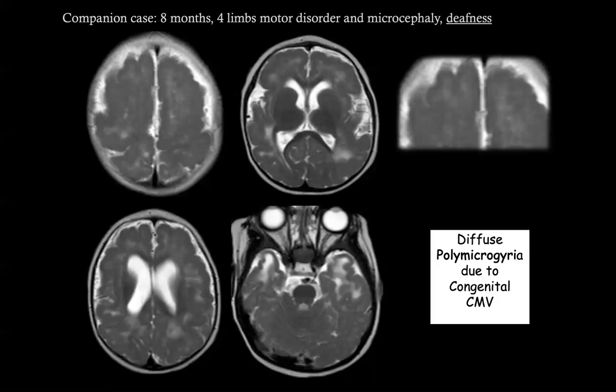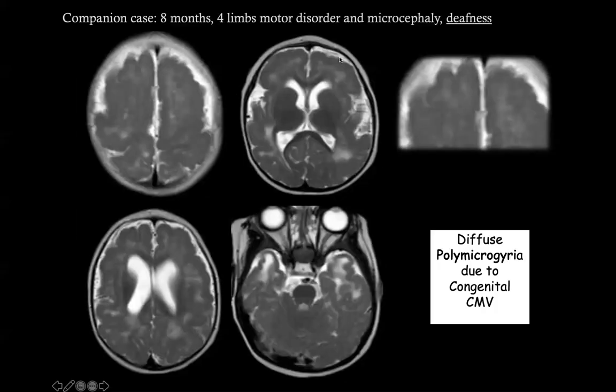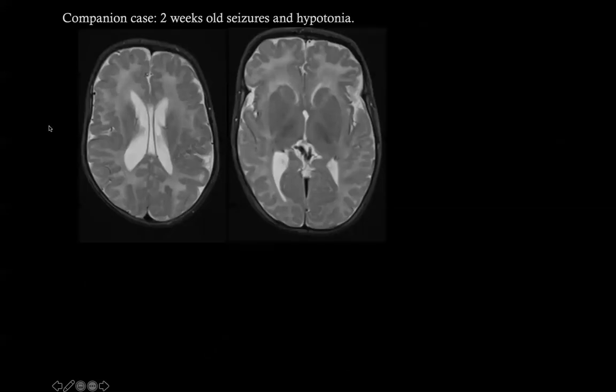Why? Because the cytomegalovirus, especially in the second trimester of the pregnancy, can interfere with the normal development of the brain and create this abnormal shape of the cortex. Okay, so it refers to basically an over-migration of the cortex and abnormal organization called polymicrogyria. We can have, however, and this is diffuse polymicrogyria, we can have localized polymicrogyria.